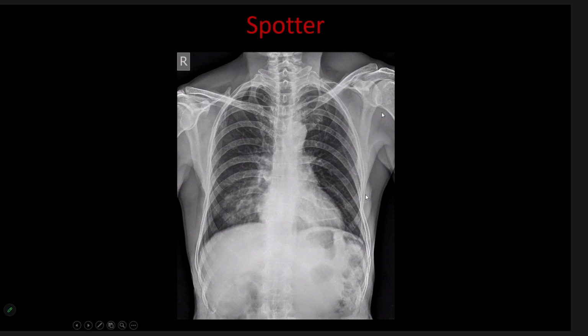Yes, fracture of the left scapula. Clearly, we can appreciate a very obvious fracture line going from here, coming here. Someone has written right scapula. No, a right scapular fracture is not there. Right is fine, absolutely. Some patchy opacity is seen in the right lower zone.